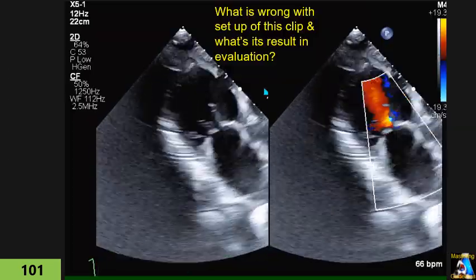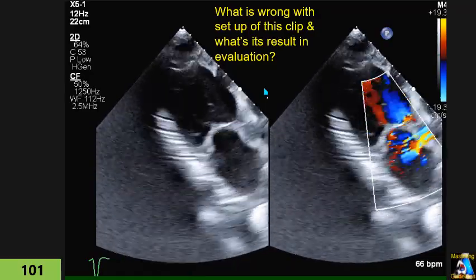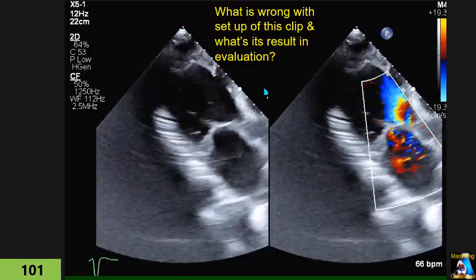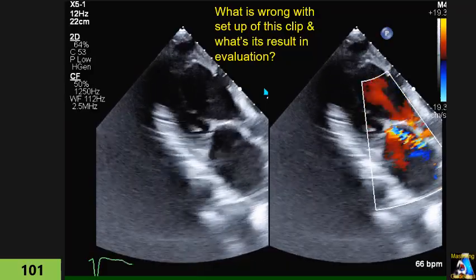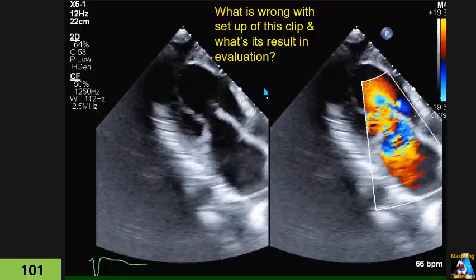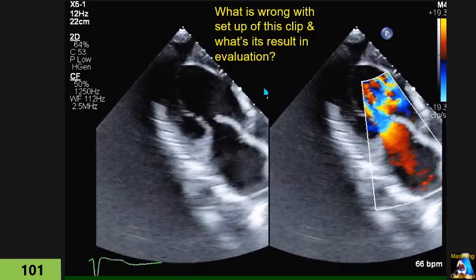This view, as you can see, is apical 3. What setup on this image, color Doppler, is wrong? And what is the result if you do this? What is the result for the evaluation of the valve if our setup is wrong, like this one?